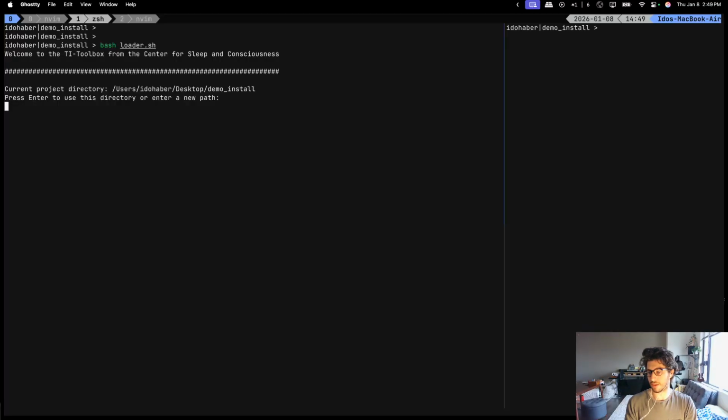So let's try to do it again. I'm calling the loader, and it remembers, it will always remember the last path you gave your loader.